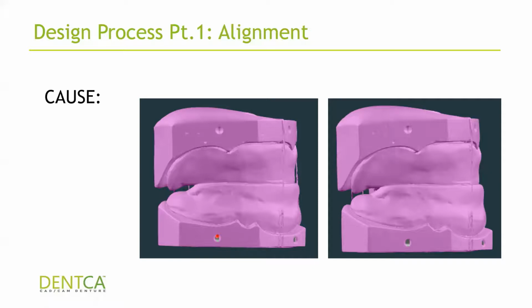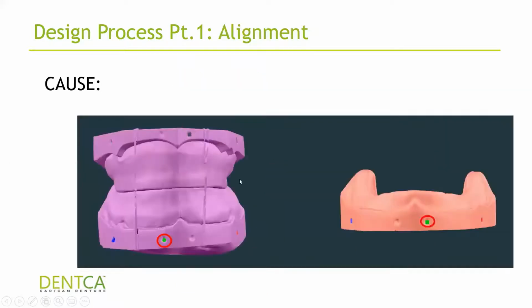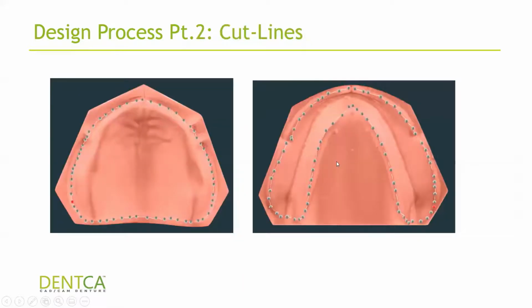Once you go from upper to lower, all the upper dots should turn gray. They should still stay there so you can see them. So if you're putting new dots over the gray dots, then you're doing something wrong. Always make sure that they're in the right arch. You can see the mismatch as well, where the arch itself does not match the shadow of the bite. This is, I guess, a very extreme situation, but basically what happened is you didn't put the dots in the position where they should have. Instead of the left, you put it on the right, or vice versa. So all you have to do is move the dots to where they should, and it should work out just fine.